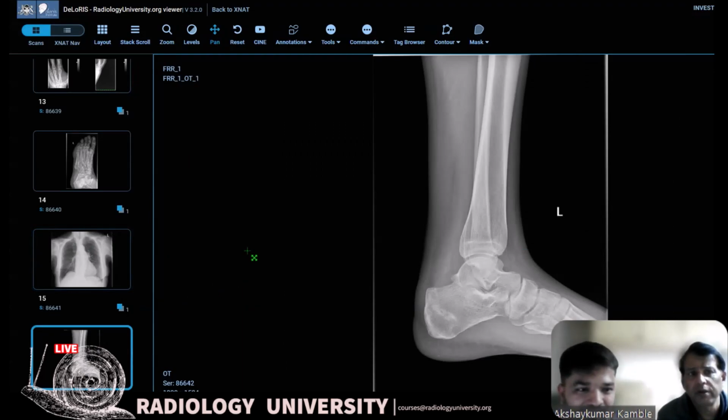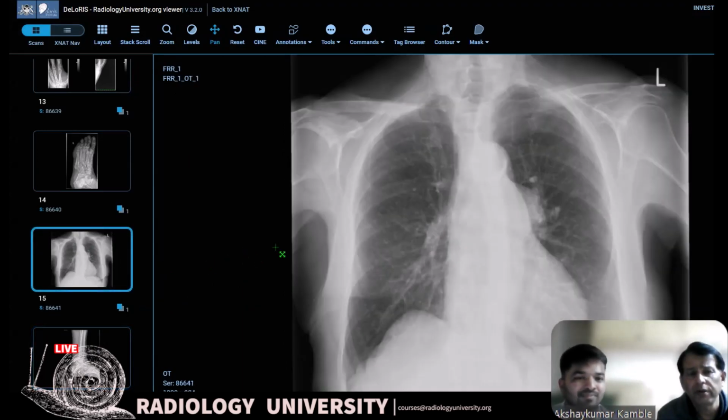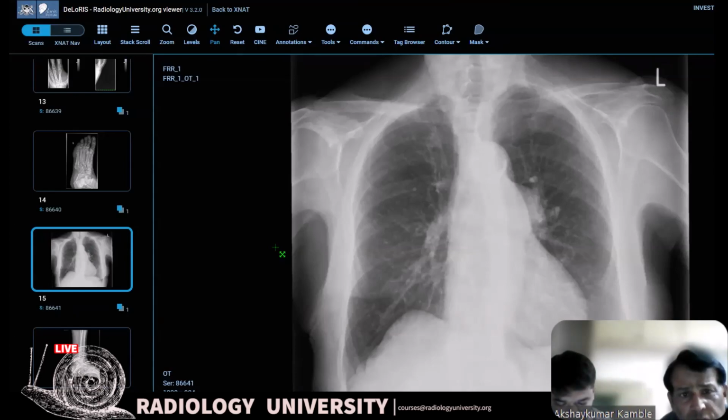I have a doubt. When do we actually say bulky hilum? Because most of the times, whenever I feel it's bulky and I type that, it turns out to be wrong. Yeah, so when the hilum is like this case, remember that the hilum, where the vessel comes out, is concave, and this is a convex hilum. So if there is a convexity and you don't see any significant rotation on the X-ray, like if you see the spinous process and the clavicle, they're not too far away from each other to account for that much rotation in this case.